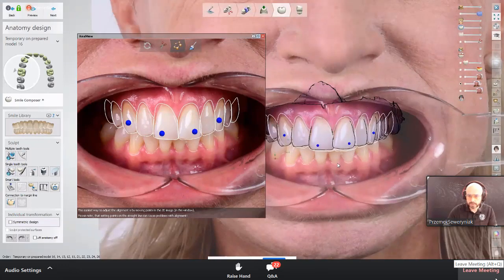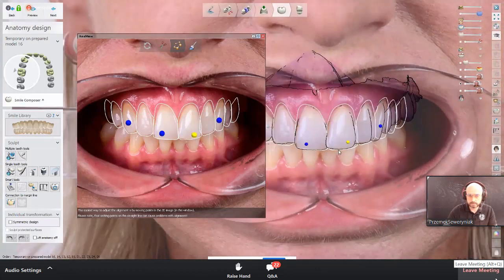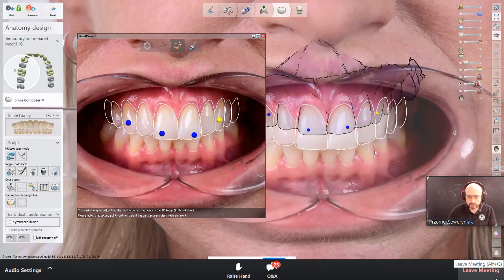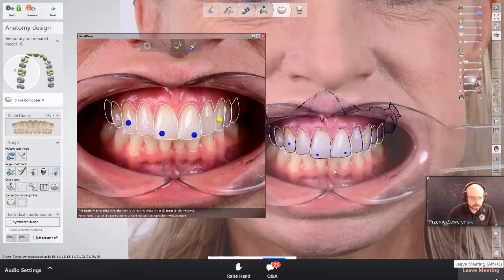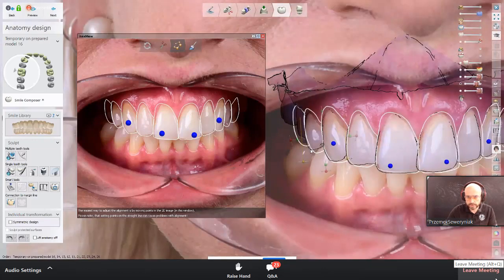So at least we can make this one work. Hold on, where am I? Okay. And we can set one more point here.